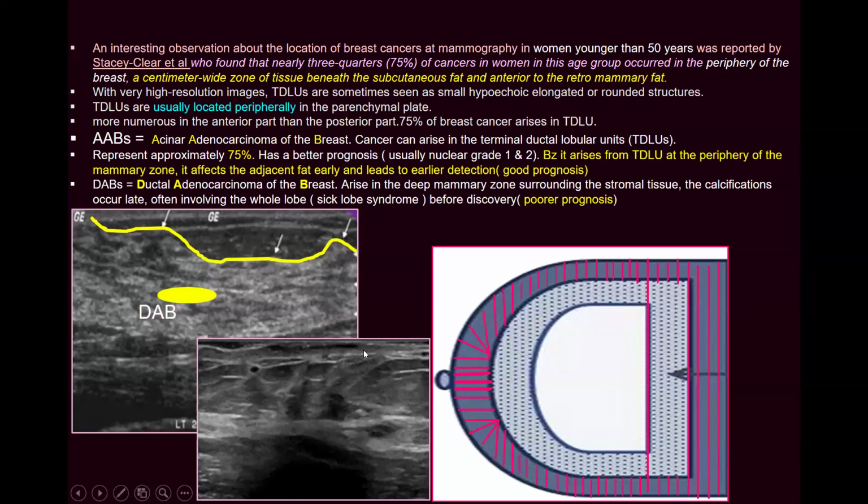So immediately it presents with change in the adjacent fat. So it will present early. That is why it has a better, good prognosis, okay?